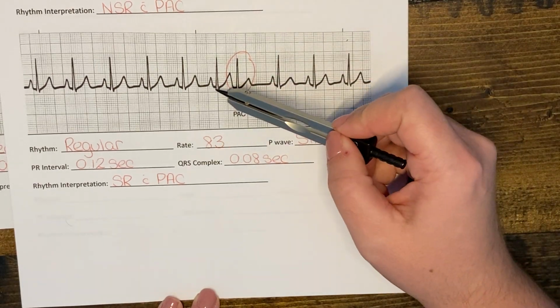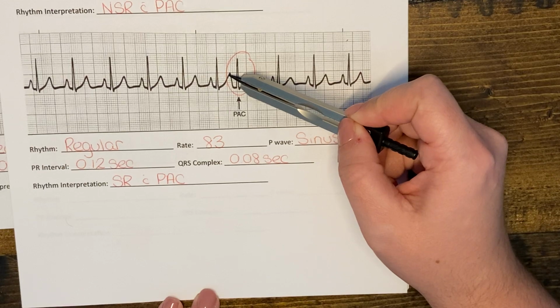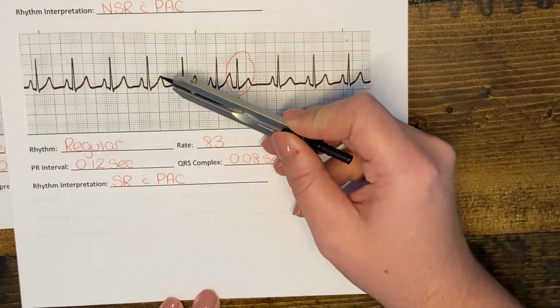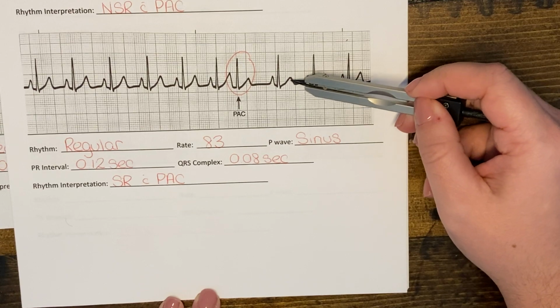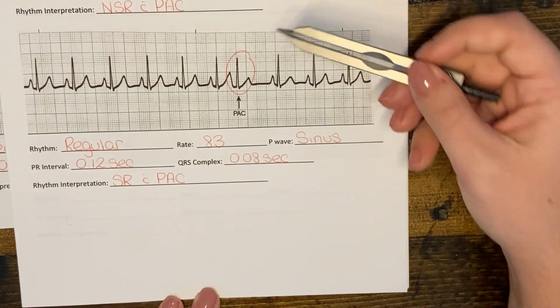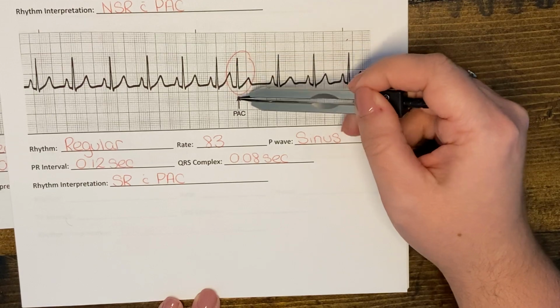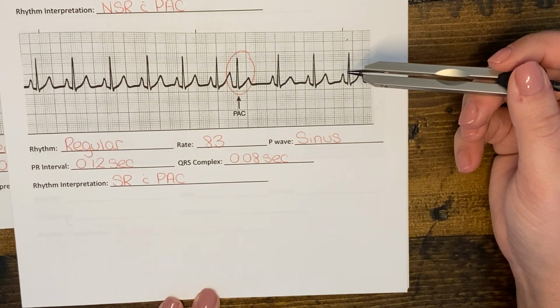But if you look at this T wave, the T wave that's following the QRS complex, you notice that this T wave is much taller than all of the ones before it and all of the ones after. So actually in this instance, there is a P wave. It's just hidden from us because it is buried within this T wave. So this is another example of what a PAC can look like.